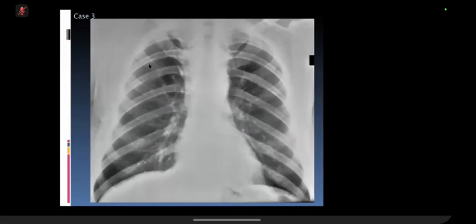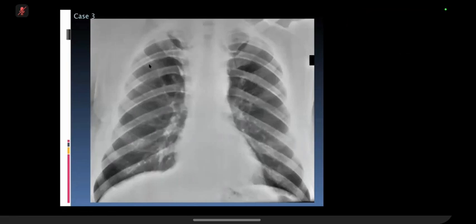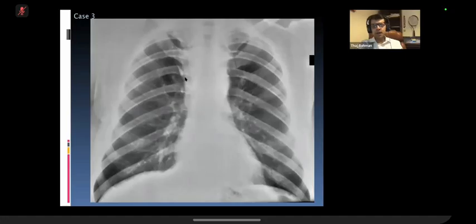Okay, frontal radiograph of the chest. So the lungs appear to be clear. There's possibly increased thickening in the superior aspect of the mediastinum. There's an azygos lobe that I can see, but there's increased thickening in the right and left. The right paratracheal stripe appears to be thickened. And so there is mediastinal widening on the right side. To keep it simple, I would just describe it as mediastinal widening on the right side.